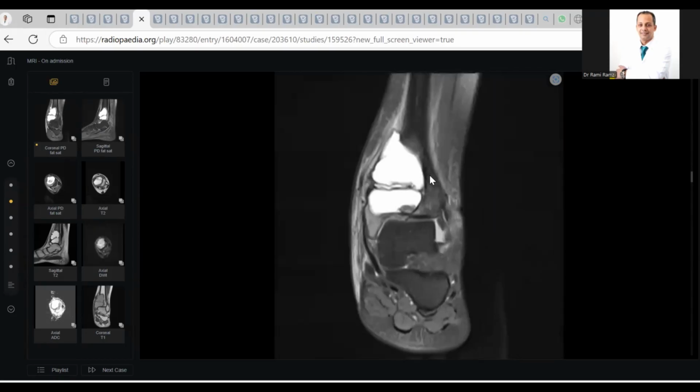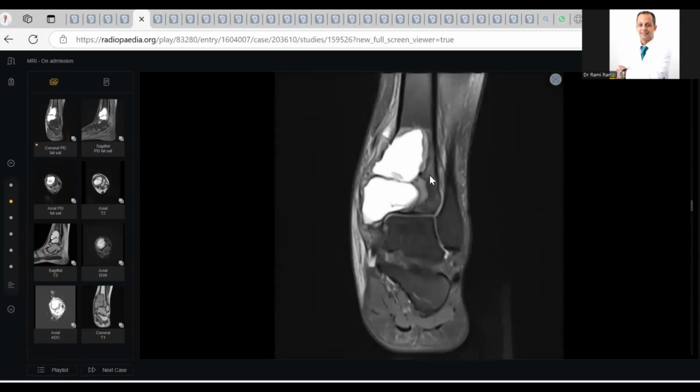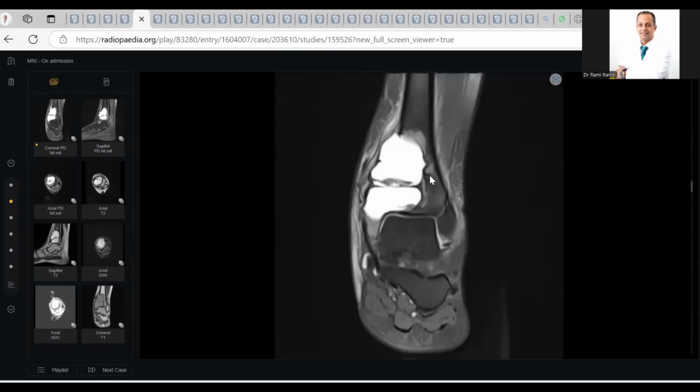You told it very well. You must transfer to a bone center. But I am waiting for you to give me more and more differential diagnosis, like chondroblastoma, but the epiphysis is closed. Or you should tell me it may be a brown tumor if the patient has chronic renal disease. And last thing, chondromyxoid fibroma, but chondromyxoid fibroma is metaphyseal.